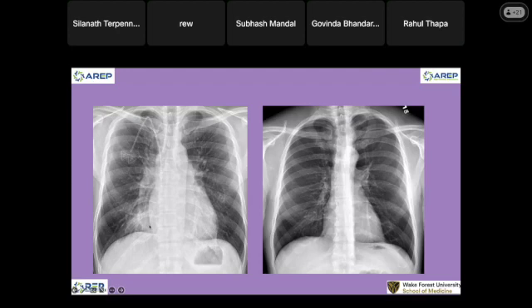In the case before, this is the left fat, but here it's more on the right. I think there's something here too. It fools you here. So the heart itself is not so big. And actually, this is cleaner. You can appreciate the heart border perfectly normal on the right, but on this one the left looks a bit funny too. The main thing here is the pericardial fat.